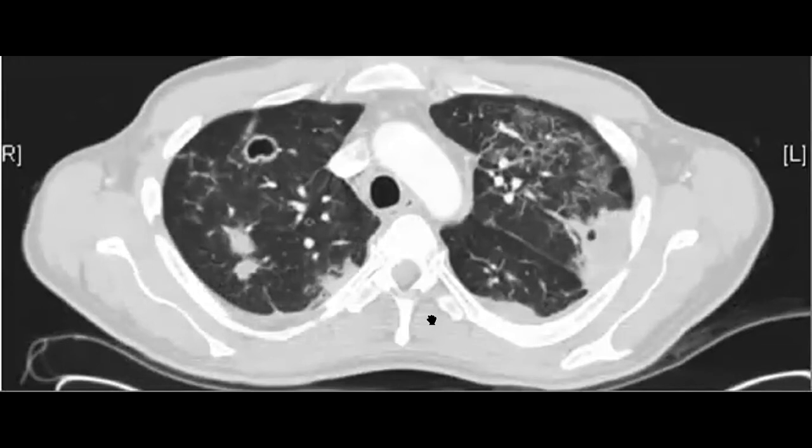So time now to jump to the differential diagnosis. Yes. So you mentioned the differential diagnosis, and I see that some of you mention Langerhans cell histiocytosis, pulmonary Langerhans, and Wegener granulomatosis. That's a good differential. So let's discuss, yeah, and maybe metastasis. And if it is metastasis, you should search for the primary. And it could be cavitating metastasis like squamous cell carcinoma.